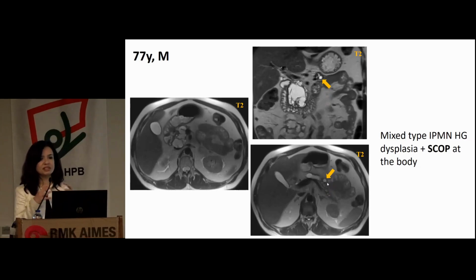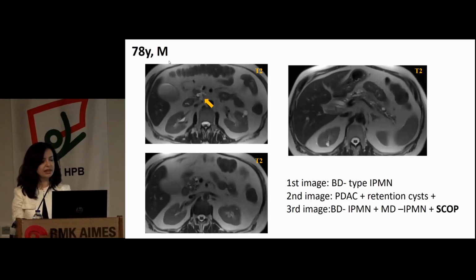Please note that this is a very simple looking, benign lesion, no contrast enhancement, simple fluid inside, and no septa or nodularity. This is again another patient with more than one cyst subtype.